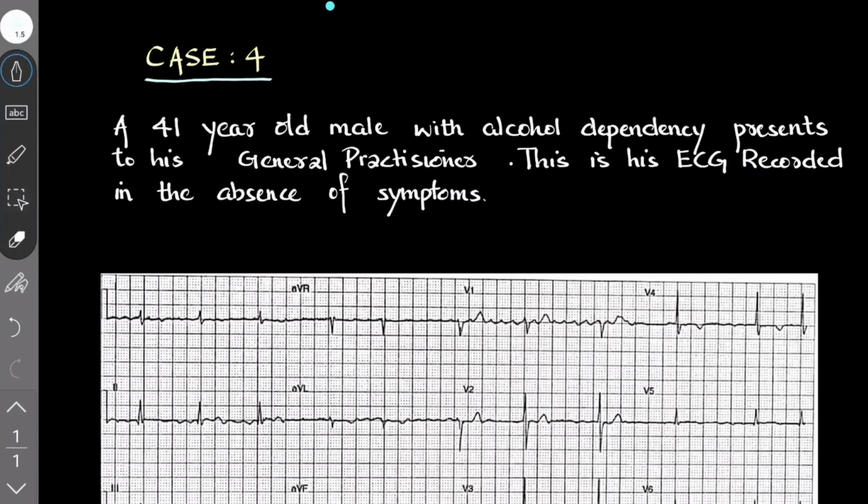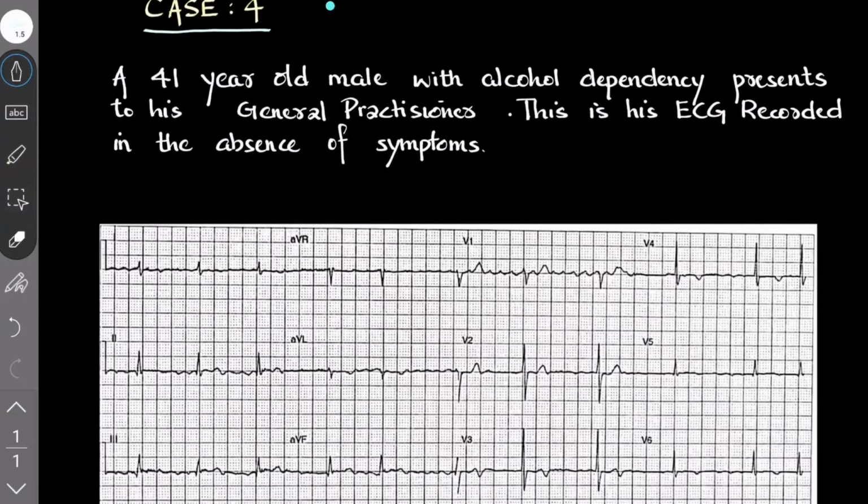Today's ECG case is a 41-year-old male with alcohol dependency who presented to the general practitioner. He does not have any symptoms but had an ECG taken. What does it mean?